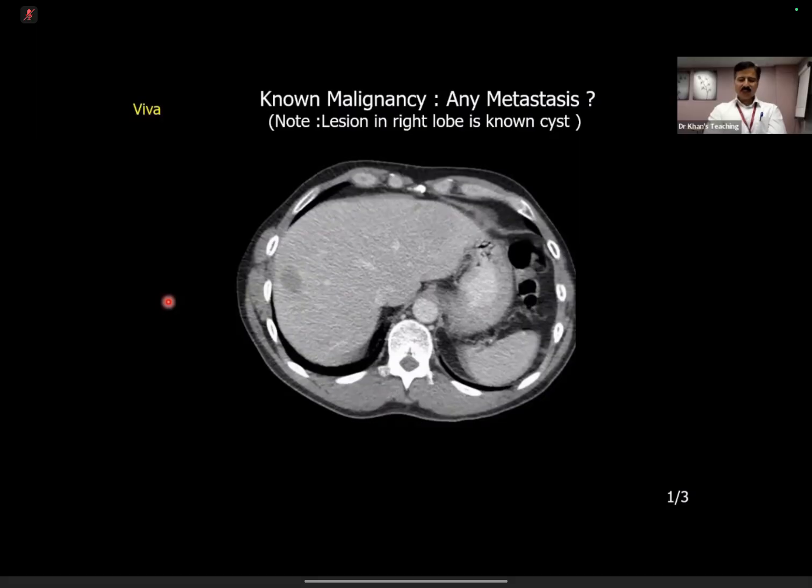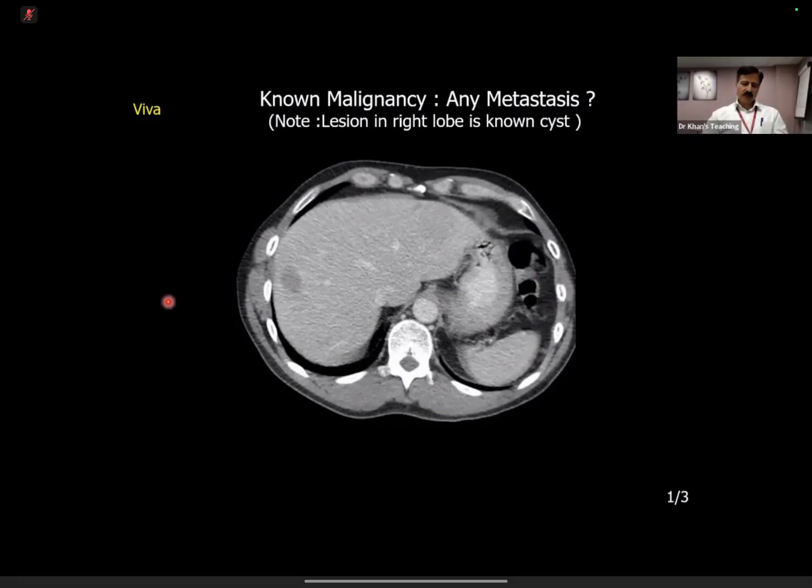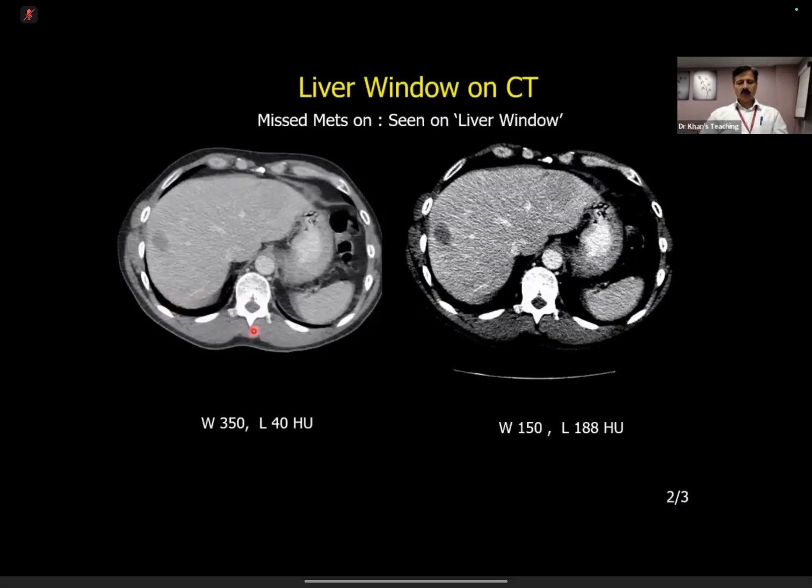For that, you are sitting in the exam. This is a viva question. Something which you can do here and then. So something I can do right here to change how I feel about this is windowing differently. Excellent. So the point here is that there is a window, this scenario has been asked by the examiners. Liver window, which increases our sensitivity. And this is the liver window in our books. It might be slightly different in yours.